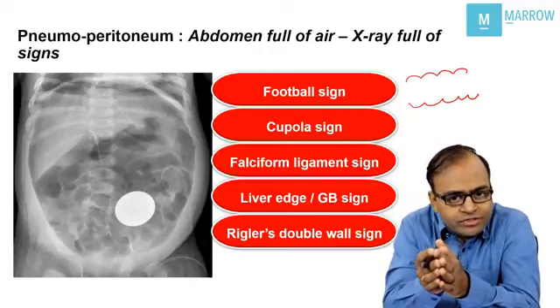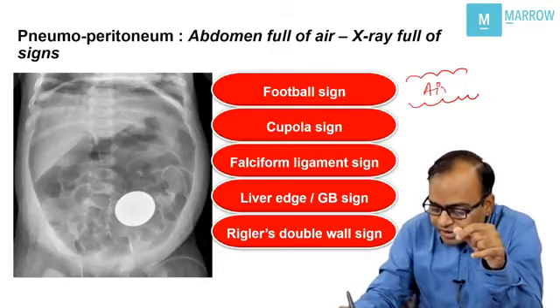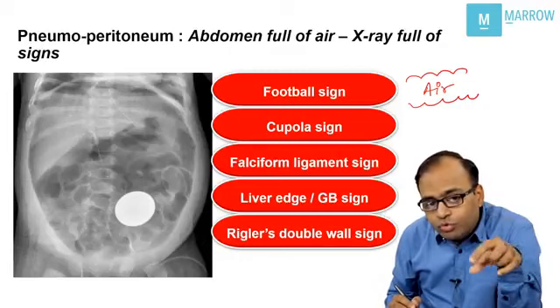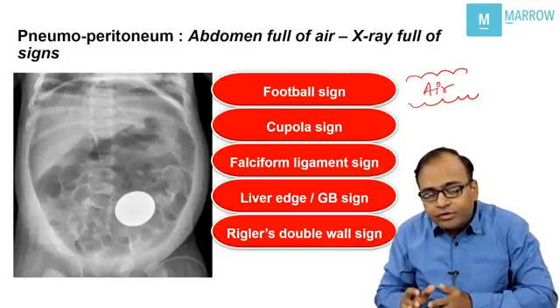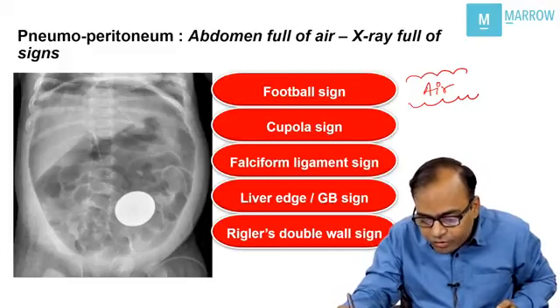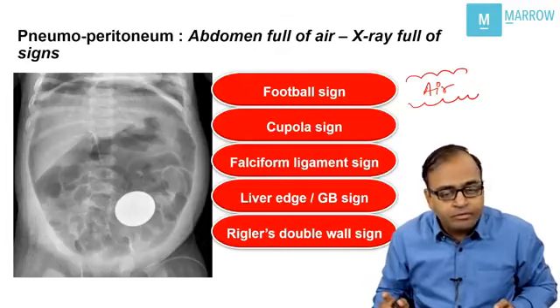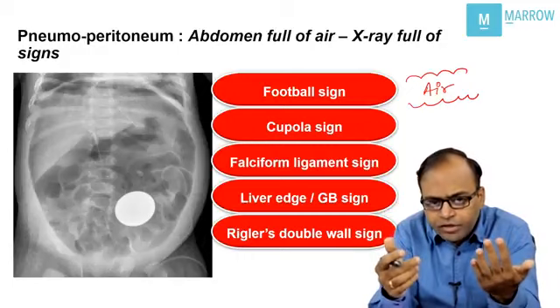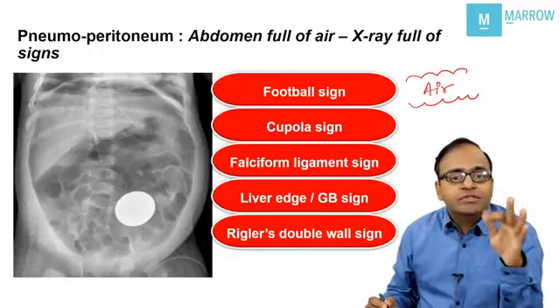Can you see the mucosal surface? Yes, in situations where the bowel lumen is going to contain air, if it is distended with air. Now the mucosal surface is bowel wall, which is water density. This creates a differential radiographic density, and therefore this creates a sharp margin. And we can see a bowel wall margin, which is always the mucosal surface or margin. So when you look at a radiograph of intestinal obstruction, you see a bowel wall margin. Remember, therefore, it is always the mucosal surface, it is never the serosal surface.